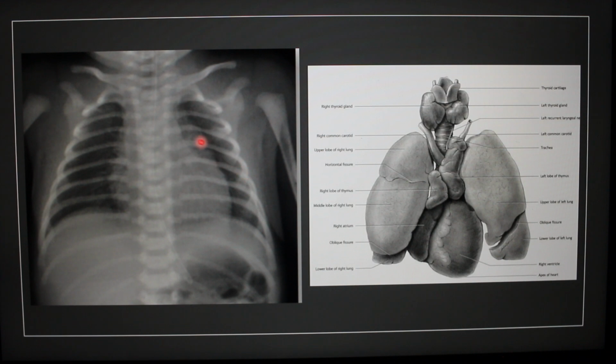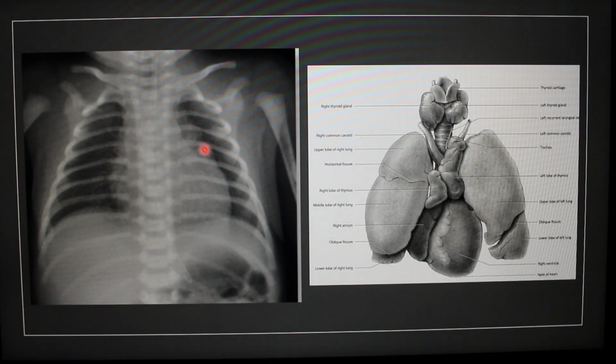You can see that the lung that is overlying this heart is relatively clear because we get nice sharp borders of this heart structure.